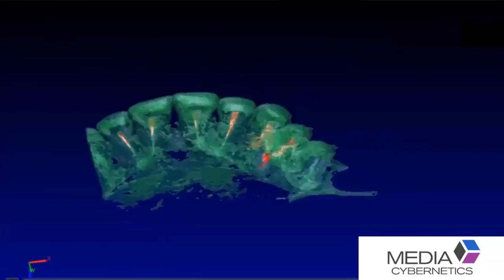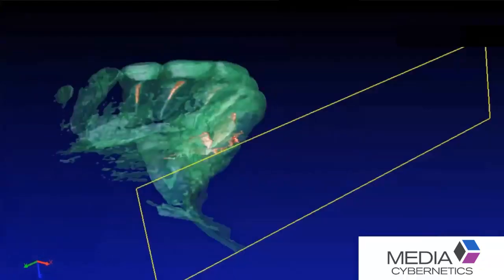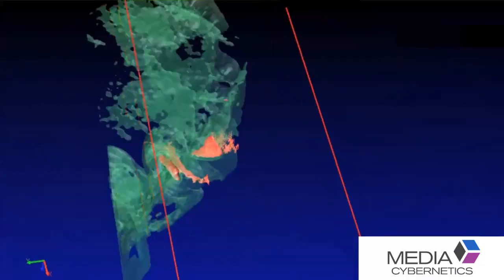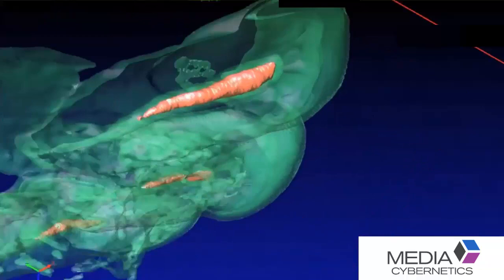Again, you can turn on or off any of the channels so that you can see exactly the perspective that you're interested in. And then here's a quick animation of turning on and off the different channels and some ortho and oblique planes that are being passed across the different tooth sections.